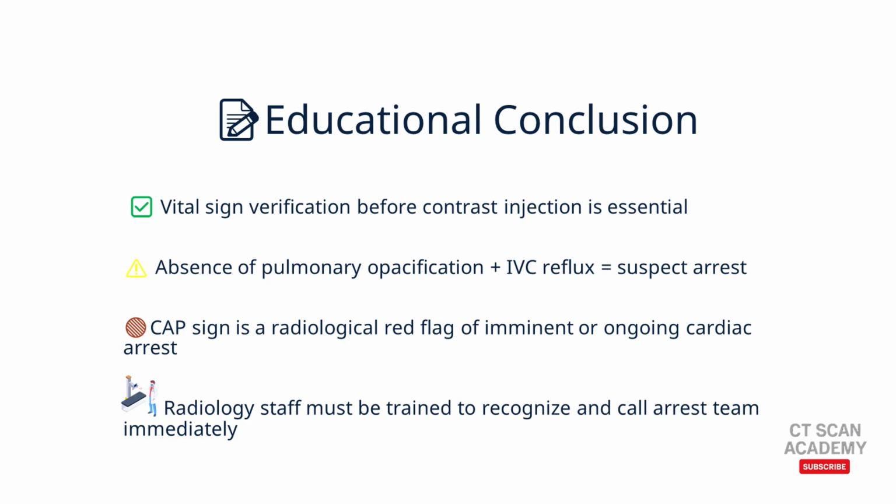Always verify vital signs before initiating contrast injection. The combination of absent pulmonary opacification and reflux into the IVC should raise immediate suspicion of cardiac arrest. The CAP sign is a critical radiologic red flag indicating imminent or ongoing cardiopulmonary arrest. Radiology staff must be trained to recognize these findings and promptly alert the resuscitation team.